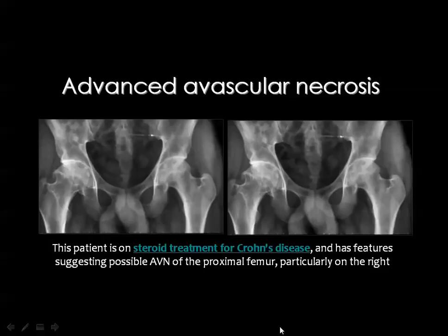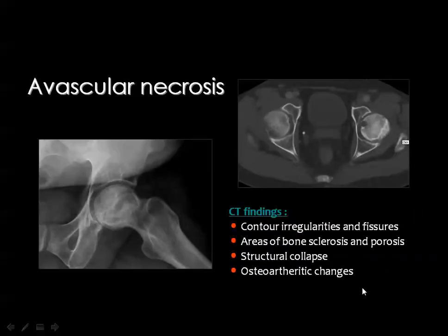Then the CT was of help in the diagnosis of avascular necrosis before the era of MRI, and the scan usually shows the changes seen in the plain X-ray, but at a relatively earlier phase.